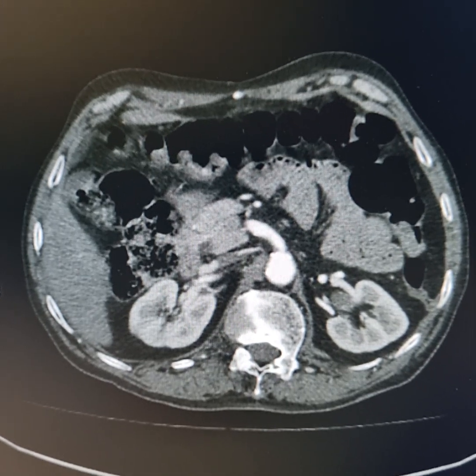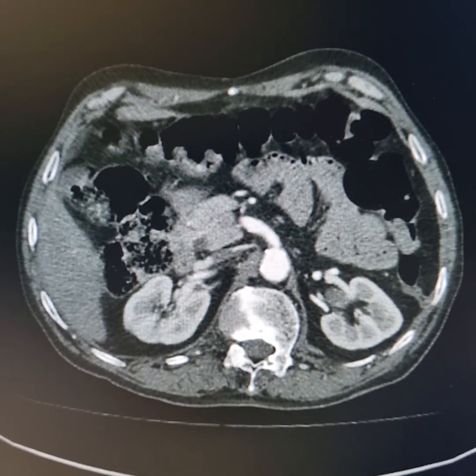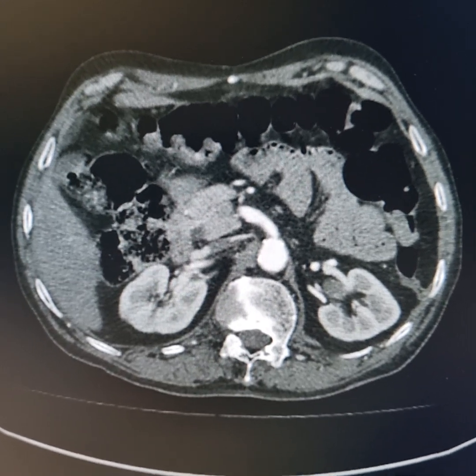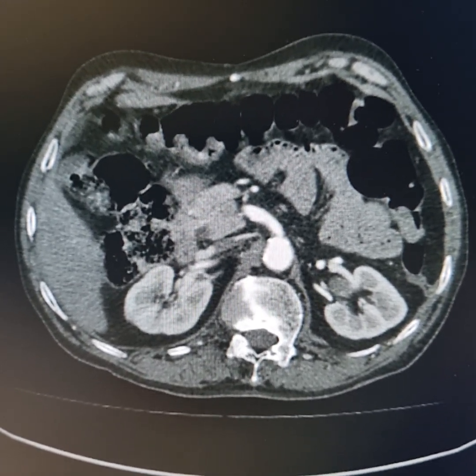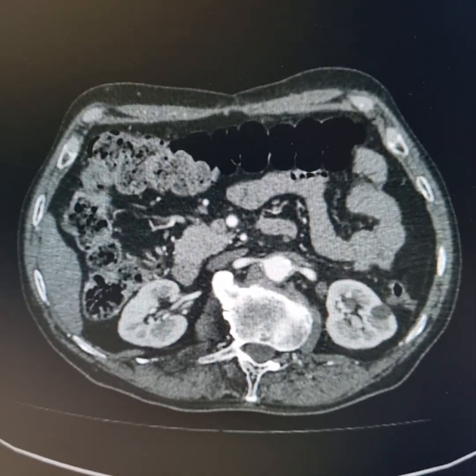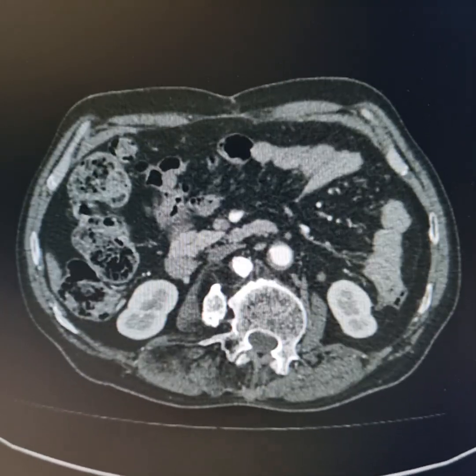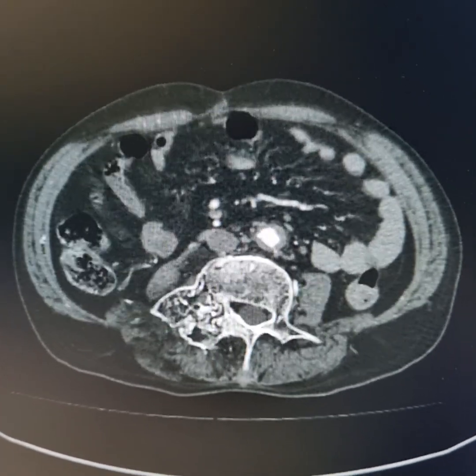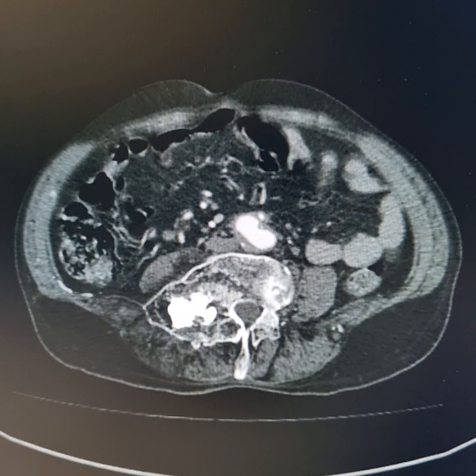This is a CT angiogram of the lower part of the abdominal aorta and both lower limbs. Bilateral aortofemoral bypass surgery was carried out a couple of months ago. Now, let us first evaluate the abdominal aorta. Partly calcified atheromatous plaques are noted along the walls of the abdominal aorta. Mild luminal narrowings are noted.